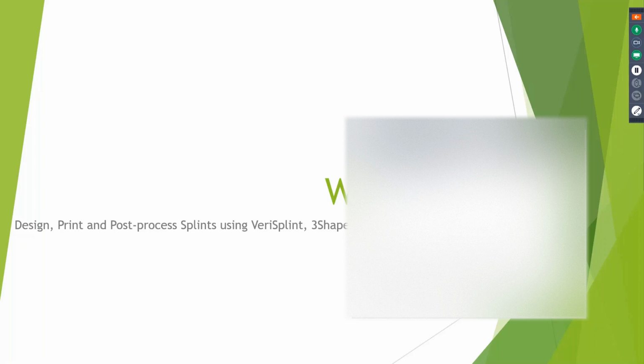How do you take off these support pins? It's a great question, Ted. So usually what I will do first, after you've done your alcohol wash, is just pinch the supports to take them off. The VeriSPLINT resin supports come off very easily. I will simply pinch them to pull off the bulk of the support.